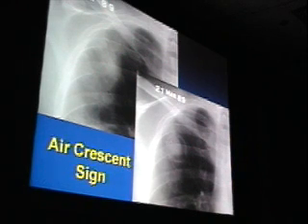And as you know, this is a relatively late finding of disease, usually seen during the healing phase of infection, when the lung tries to clean up and begins to cavitate in this peculiar fashion. You're also aware that this intraluminal mass is not technically a fungus ball. It's actually a piece of sloughed, infarcted lung. It is usually adherent to the lateral wall of the cavity.